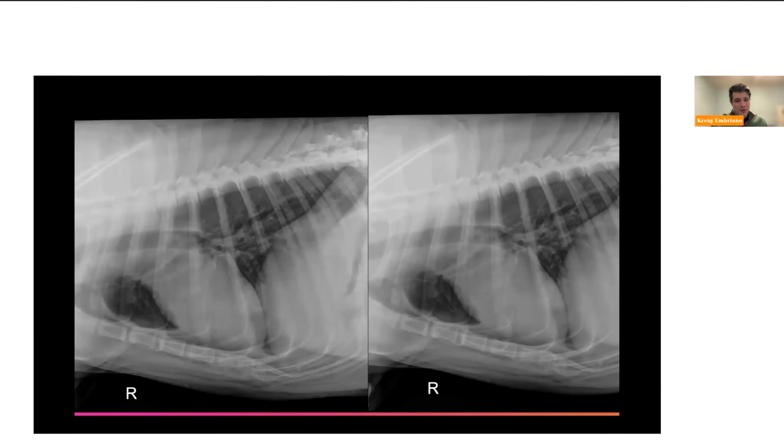This dog also has structured lesions. These are not well visualized, or not nearly as clearly visualized as in the prior study. If we look very, very closely in the craniodorsal lung field, you'll start to see an increased opacification. There are some margins you can start to delineate now that I'm highlighting them on the other view. And if we look more caudoventrally in the same view, you're going to see another lesion, right? Again, not the sharpest margins, but now that you see it, it's kind of hard to forget it.